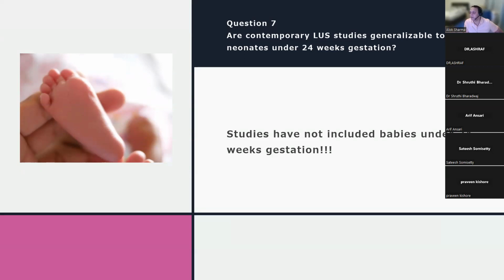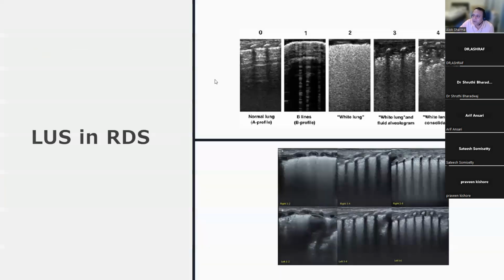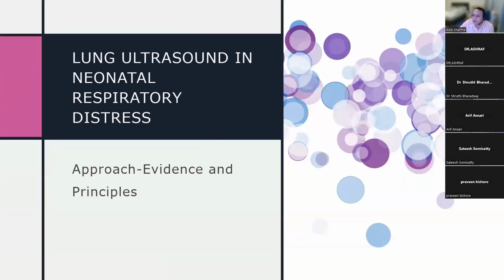There was pulmonary hypertension over there. But because we're in 60%, really the question is just giving this baby more time rather than rushing in with another dose of surfactant. So that, in summary, is really the approach that you need to think of in terms of your implementation of the use of lung ultrasound in babies with neonatal respiratory distress.